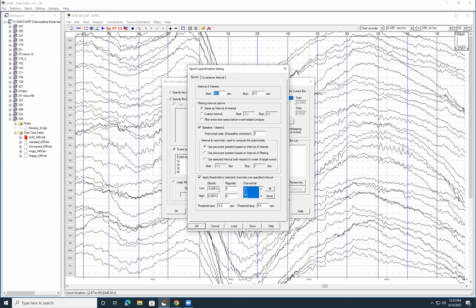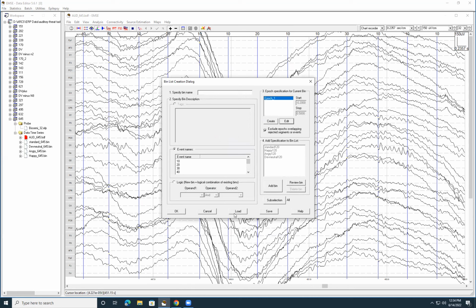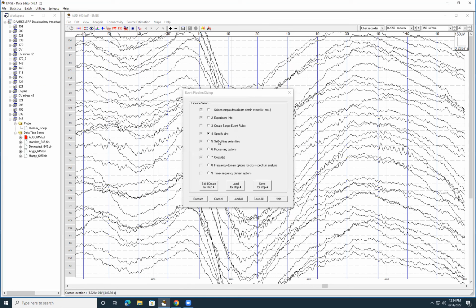So we're still playing around with these 2 different levels of filtering, the 14 versus the 12 level of filtering. And so we can run the scripts both times. You'll get a different number of trials, which is also something that we're going to look at next. So we're going to cancel all this because we don't actually want to make any changes.